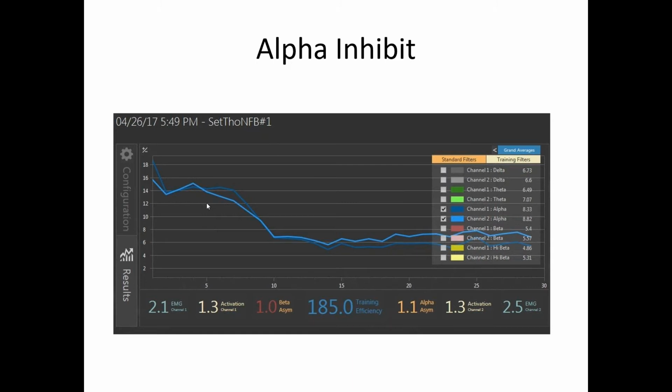We want the layering to be delta, and then theta, then alpha, and then beta if we're doing eyes open. So that's the layering we're looking for. Delta is the highest amplitude, then theta, then alpha, and beta. And they can be all close together in the slow waves, but you want those slow waves apart from the fast waves. You don't want them together.